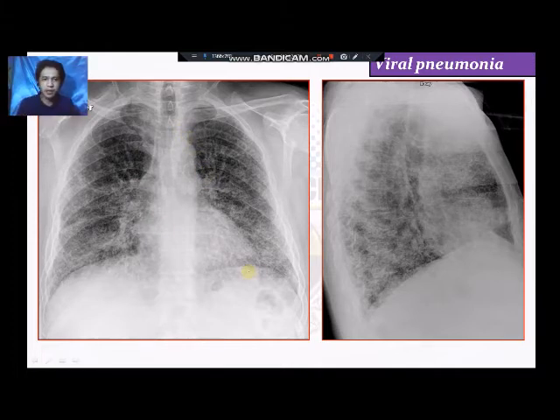Both the left and the right side of the lungs of the patient should be equal in density. But because of the pneumonia, which is related to fluid accumulation within the lung tissues, we see whitish, radiopaque appearances, and there is a slight increase in the opacity of the vascular markings. That is because of the fluid accumulation.